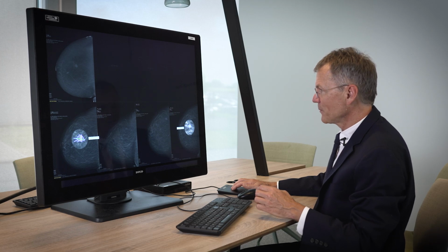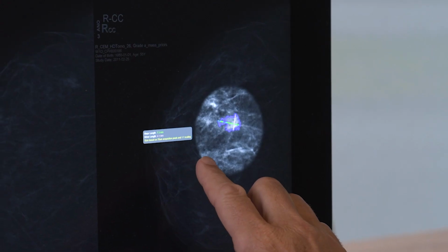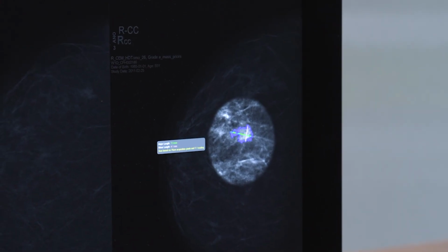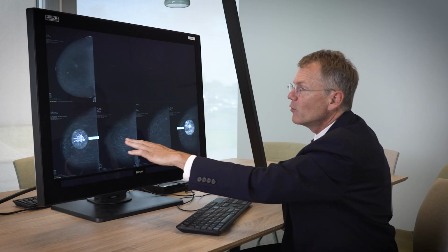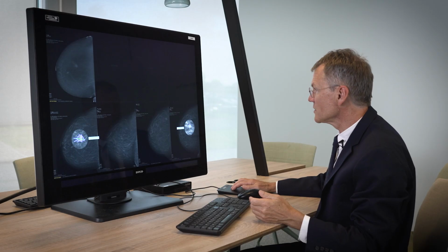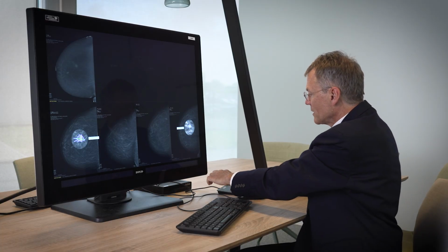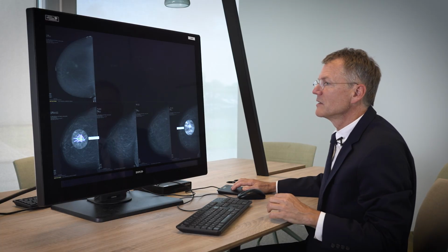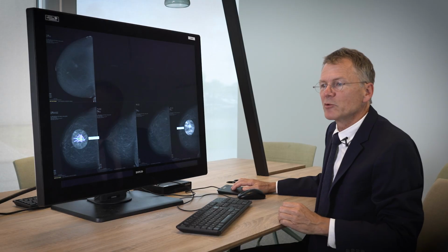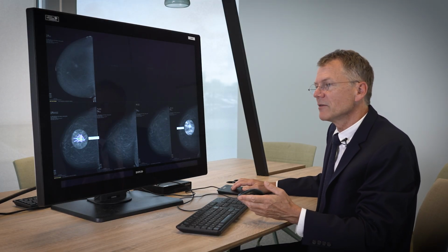And then I can say, okay, I can compare these two, and I can see that this one now is 7:4, whereas here it's 15:7, and you can see how much it's increased. And then, of course, I can use the third button, and I can save off this picture, and I'll have a snapshot of these two images in the report that's saved as an image.